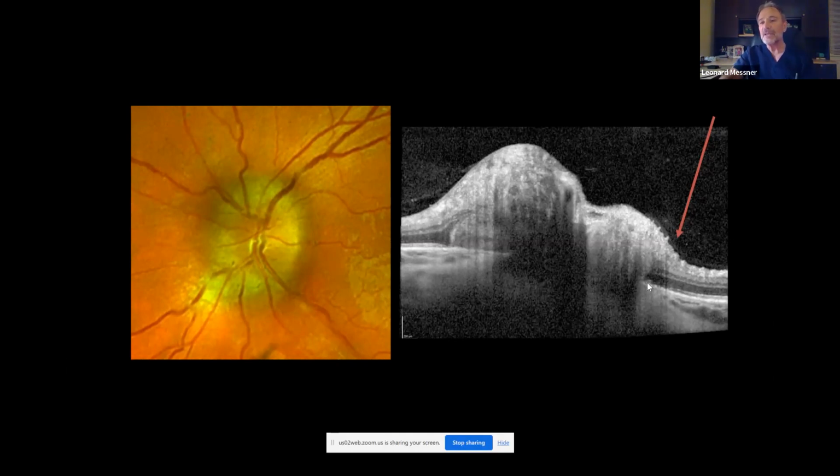Ischemic optic neuropathy, central retinal vein occlusion, anterior optic neuritis. So it's not diagnostic for papilledema, but it is helpful in differentiating, for instance, papilledema from pseudopapilledema. It's very, very unusual to see these peripapillary wrinkles with pseudopapilledema. You see them almost uniformly. You see them almost 100% of the time among individuals with true papilledema.